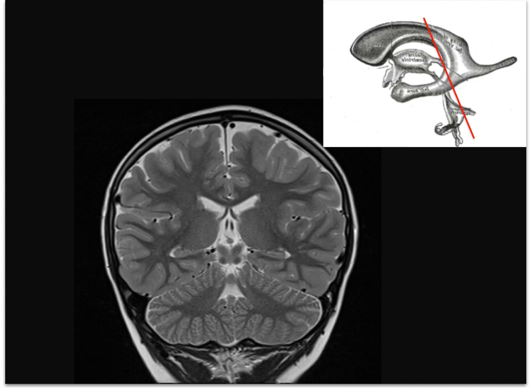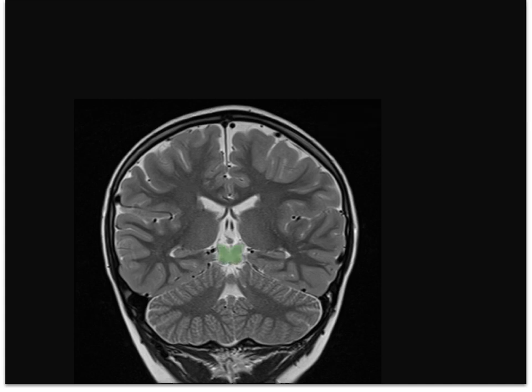This is the level of the quadrigeminal plate, which is this somewhat square structure in the midline. And the quadrigeminal plate is made up of the right and left superior colliculi mediating sight and the right and left inferior colliculi mediating hearing. The pineal lies in the midline above the quadrigeminal plate. The posterior thalami have an ovoid or egg-like shape in this plane.